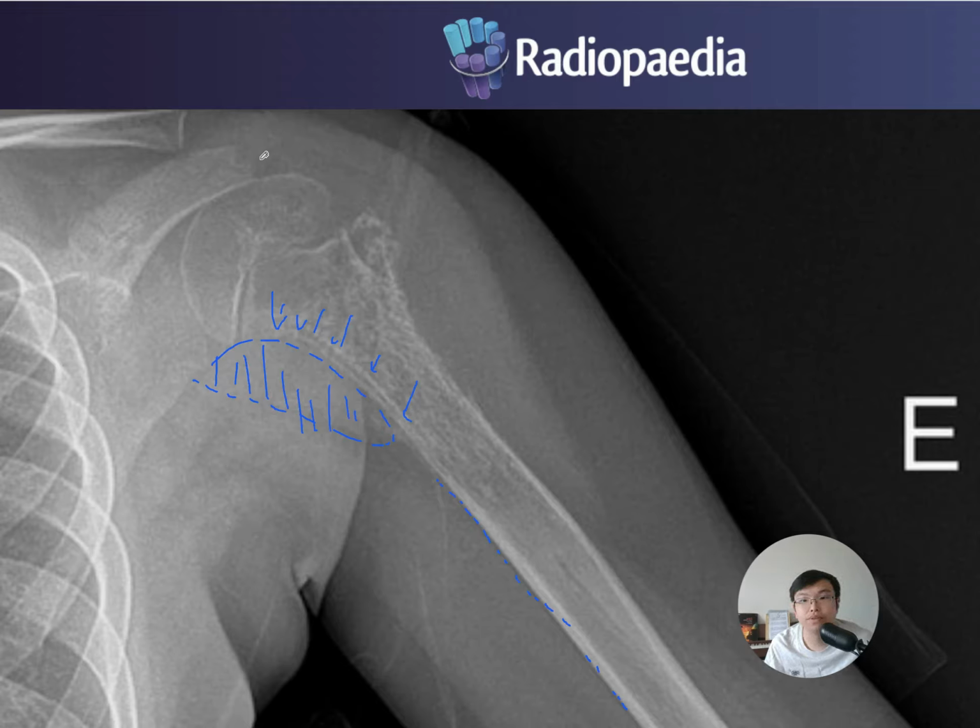And also, I will tell you that, okay, this is the cross-section of the deltoid muscle, which is a thin, broad muscle like here, but you do not expect to see such an increased opacity underneath it, okay? Either there is fluid at the bursa underneath the deltoid, or it may be some soft tissue component which elevates this deltoid muscle, okay?